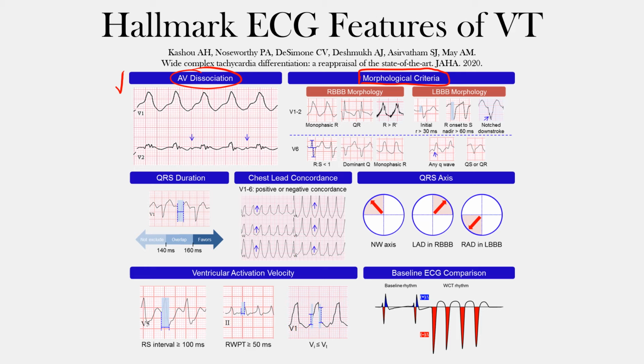Now in this lecture, we're going to focus on the importance of the QRS morphological criteria in differentiating wide complex tachycardias. So this one here. And here's the article, if you want to take a look at it yourself, and you'll have access to this image here if you would like. So let's get started.